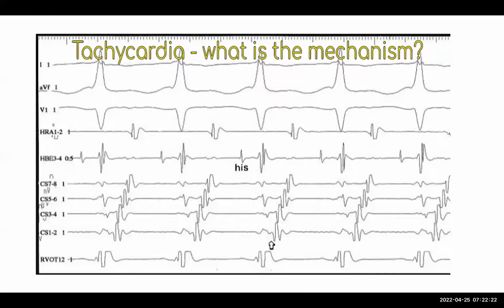I guess not. Yeah, you can't tell. You cannot tell in tachycardia if the patient is WPW, because the accessory pathway is conducting retrograde in tachycardia, and antegrade we're going through the AV node. So until tachycardia breaks, you would not know if this is concealed or a manifest pathway.